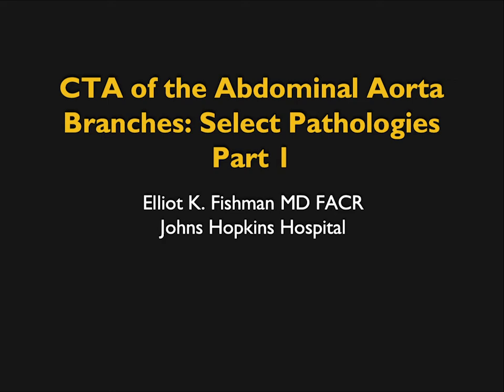This is going to be on select pathologies in the abdominal aorta. And we're not going to focus on the abdominal aorta per se, but the branch vessels of the abdominal aorta, like the celiac and SMA and renal arteries and IMA. I won't go through all of them, but I am going to cover a number of specific pathologies.